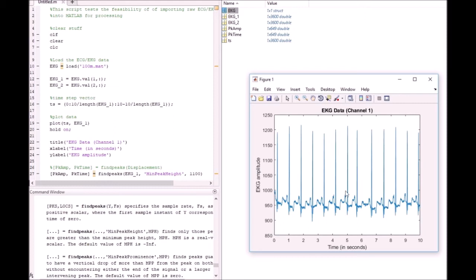And it depends really on which channel you're using, because there's going to be a whole bunch of channels, like if you're using 12 lead. And some of those are going to be all messed up. But you can use the same technique for picking up all sorts of things, like ST elevation and all the different disorders you can have. So this is one way to do it.